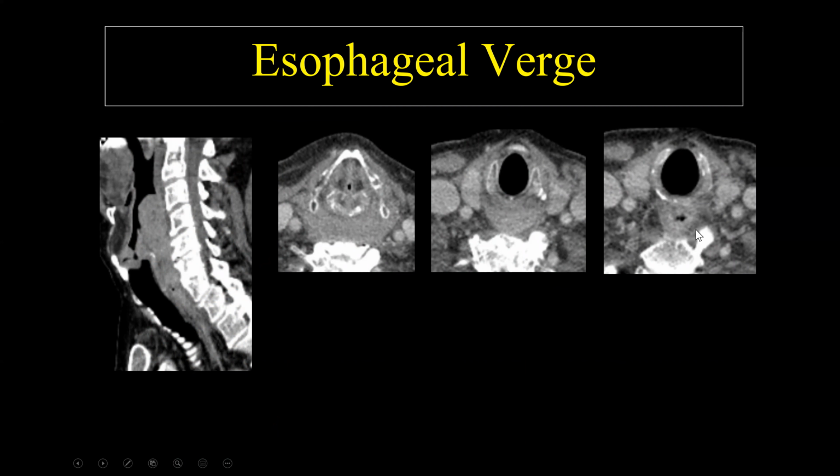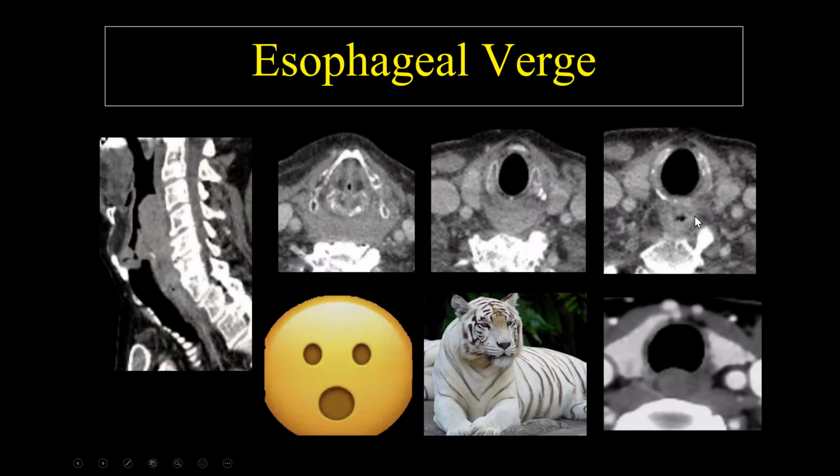Now, one can say, now hold on for a second, this looks round, so what are some other things that we can look at to ensure and increase our confidence that we're looking at tumors? Well, first of all, we want to see whether it's round, and it is round.